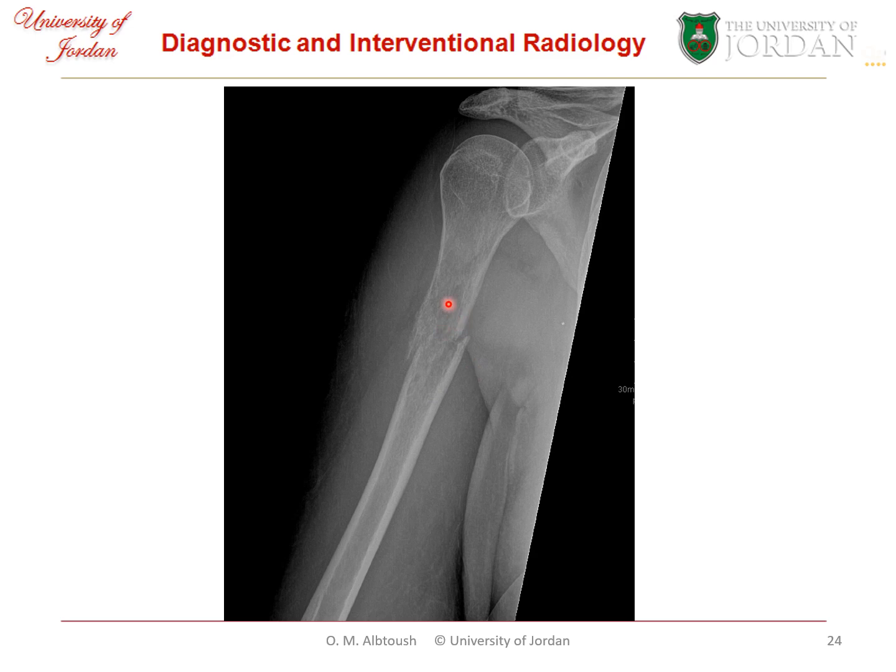Another example here, we have permeative changes. In fact, there is no explanation for permeative changes in an acute presentation. In acute presentation, we don't have, for example, the disuse osteopenic changes of the skeleton. So we have permeative changes here. We need to mention that we are suspecting an underlying pathological mass that was complicated by pathological fracture. As you can see here as well, we have cortical destructive changes, so the cortex is not sharp either.